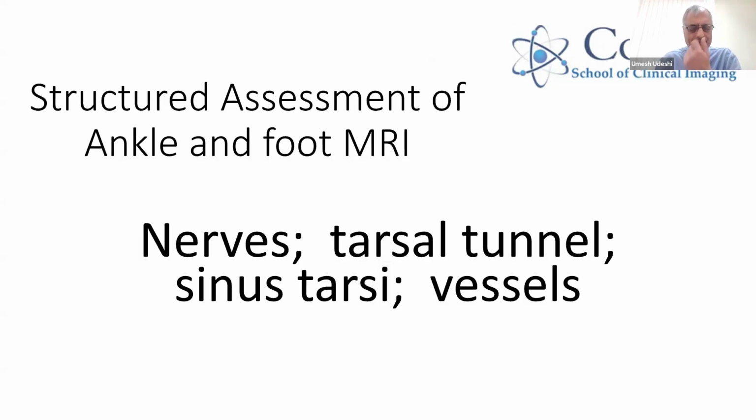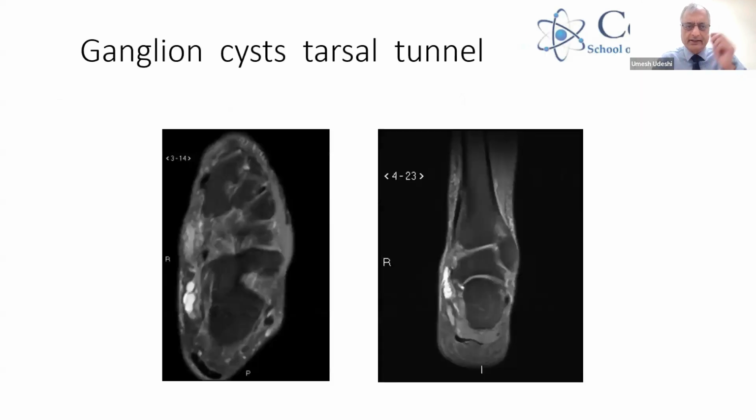Okay, just going on to some other conditions of the hind foot. So here is an axial image on the left and a coronal image on the right, fat suppressed images. You're seeing some cysts on the medial side of the calcaneum and talus.